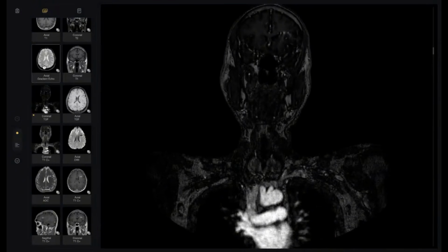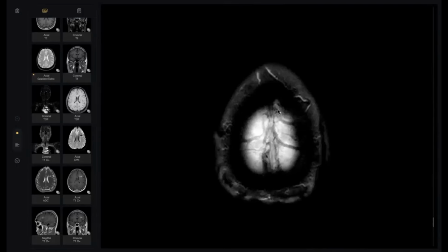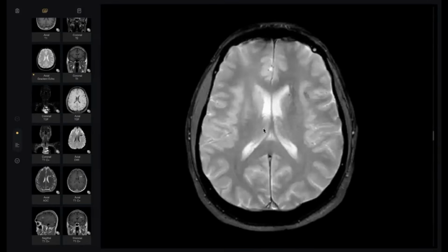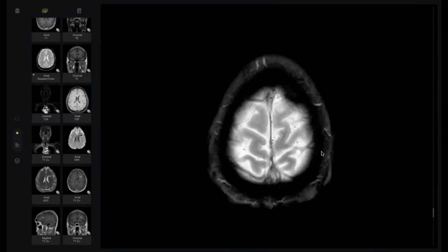Okay, my colleagues, I want to give all of you a bit about the venous system of the brain because most of us are not familiar with it. For the brain venous system, we have originally two systems. The dural sinuses: superior sagittal, inferior sagittal, transverse. All of us know this system. Then the cavernous. And what else? And directly to this, sorry, where is the gradient? This is the gradient.